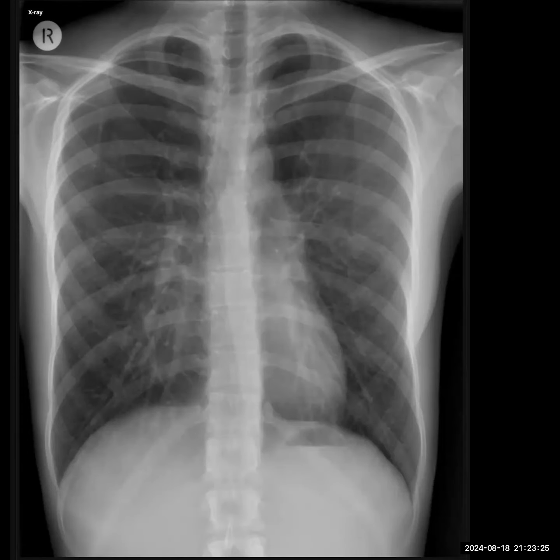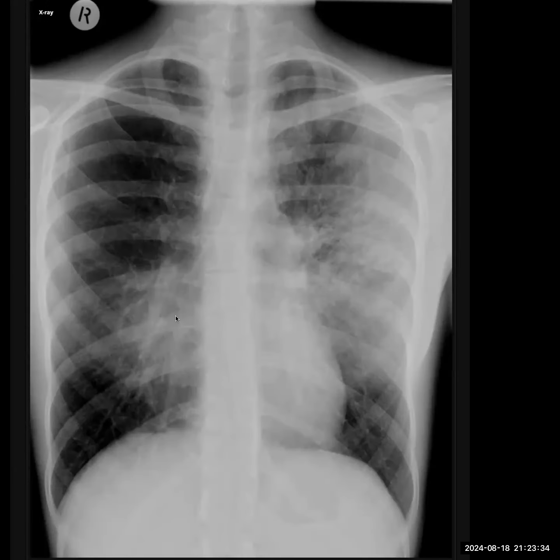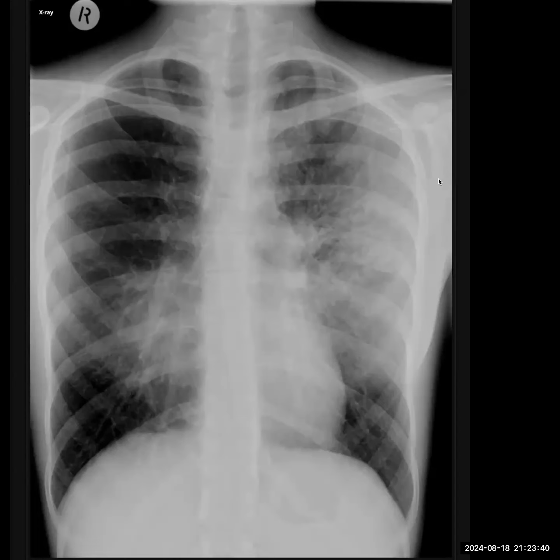So the clue lay in the fact that this patient has some amount of pectus excavatum. So this one is due to the pectus deformity, whereas this one is due to the infection, the pneumonia that you described perfectly, but you'll still get 6.5 here because the clinical management and everything did not change because you missed this finding.